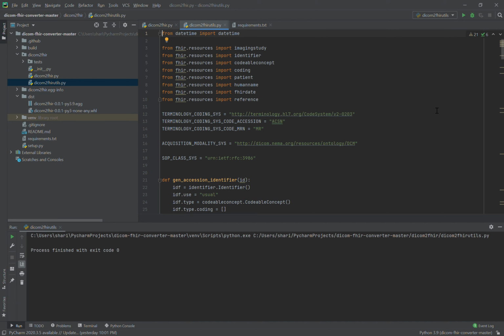Hi. So this video is for going over our implementation and deployment of a Python library, which basically converts DICOM to FHIR objects, DICOM images. It's an open source Python library that accepts a directory as an input, and that directory is supposed to contain DICOM images.